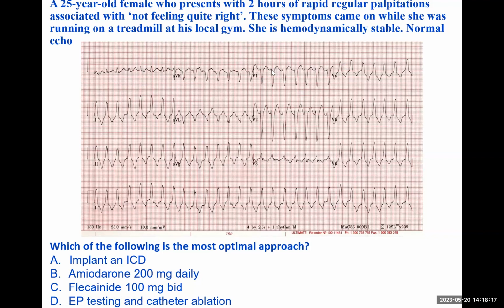If you look at the ECG, it is left bundle-like, and it is positive in the inferior leads. We have a young patient with a structurally normal heart, so VTAC from the history is unlikely. But when we look at the ECG criteria, it actually goes with VTAC because of the morphology itself, and because we have this morphology typical for the condition which is outflow tract VTAC.